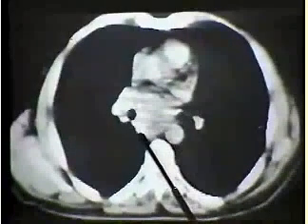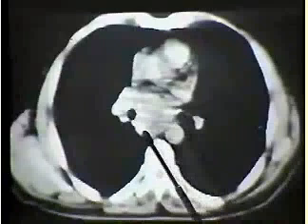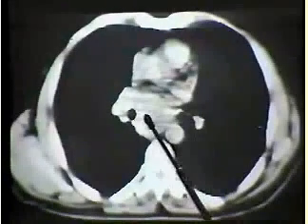Well, the CT scan is going to look pretty dramatic. This is an old CT scan on this case, and so it's not very good quality, but it shows obviously a huge mass encroaching on the azygoesophageal recess. The right bronchus intermedius is almost completely encircled by tumor. You didn't need a CT scan to analyze that case.